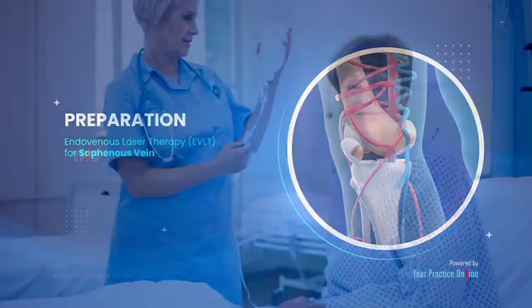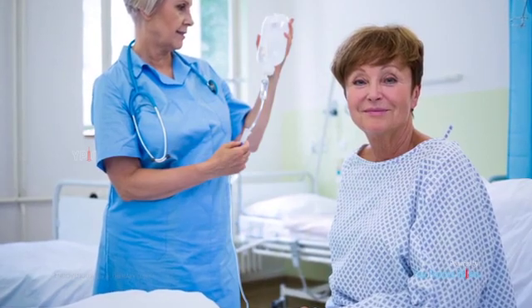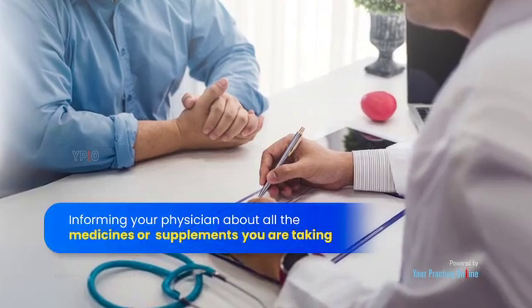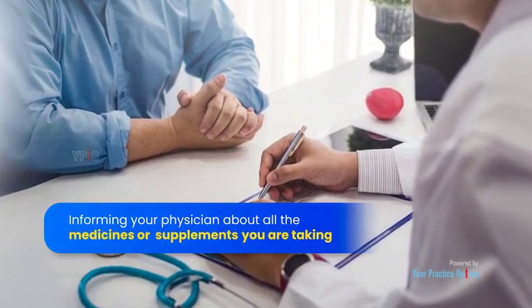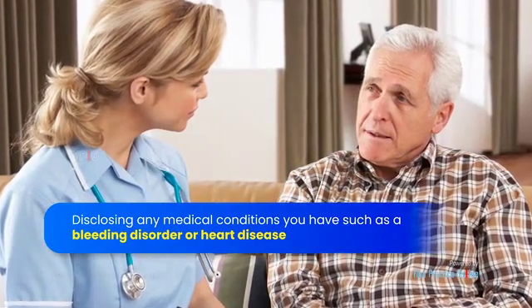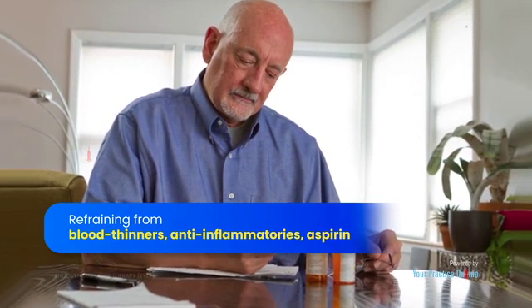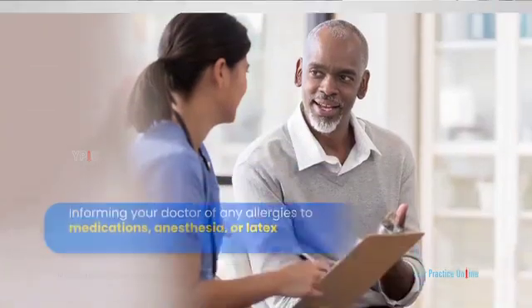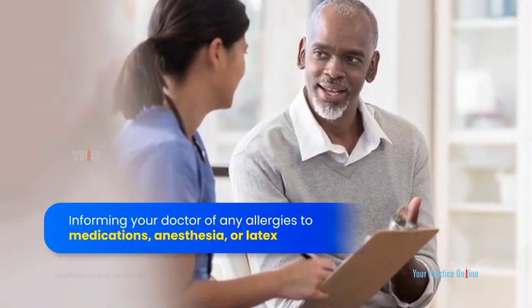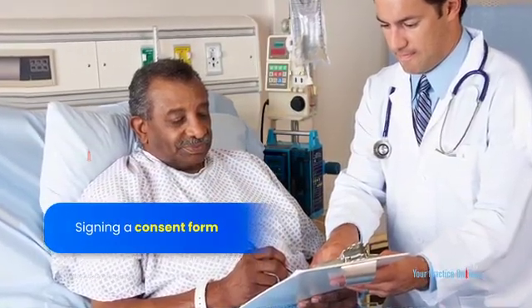Preparation. Pre-procedure preparation for EVLT of the saphenous vein may involve the following steps: a thorough history and physical examination, informing your physician about all the medicines or supplements you are taking, disclosing any medical conditions you have, such as a bleeding disorder or heart disease, refraining from blood thinners, anti-inflammatories, aspirin, or other supplements for a week or two, informing your doctor of any allergies to medications, anesthesia, or latex, signing a consent form after the risks and benefits of the procedure have been explained.